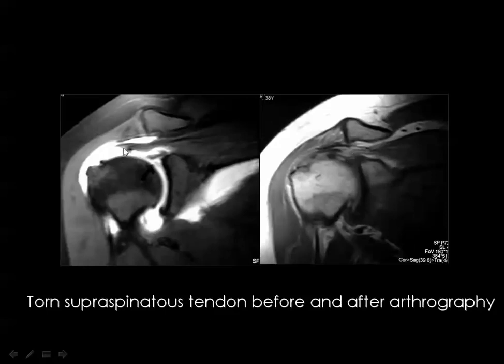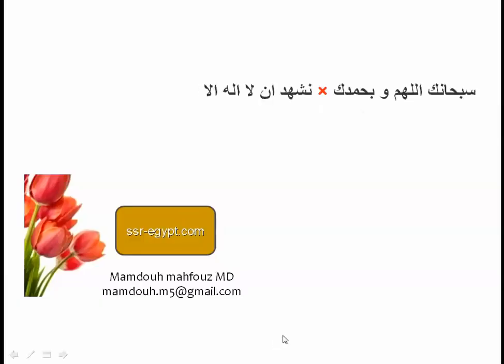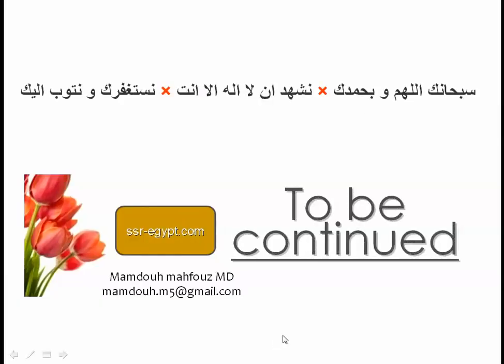But here you can see full thickness tear of the supraspinatus tendon with retraction, and a gap between the cut edge of the tendon and its insertion site. And also you can see this superior labrum with an internal bright signal denoting a SLAP injury, as I will explain later on. This was the end of the first part of the imaging of the shoulder.